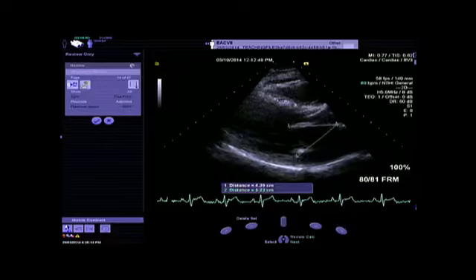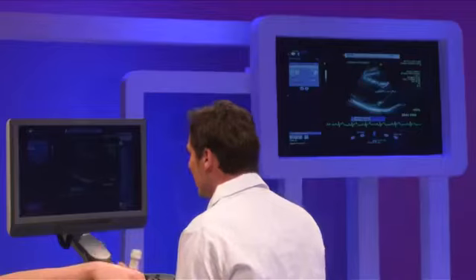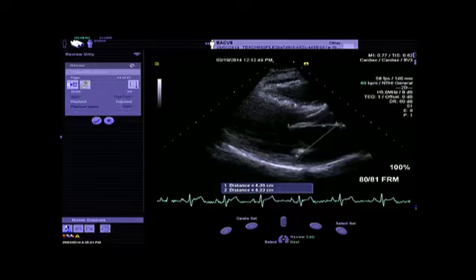And clearly the mitral annulus is dilated, 52 millimeter. And if you have the ratio of 52 above 43, you have almost 1.2, 1.3. And the cutoff to define severe or to define dilatation of the mitral annulus is 1.3.